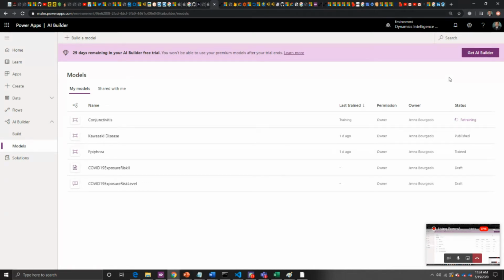You need a lot of training data to be able to do that. And again, if you try different kinds of images in this example, you could get better results. But we'll see. We reduced it. One of the challenges is that we had these 25 images that were not conjunctivitis. So what are the variables that could determine that?